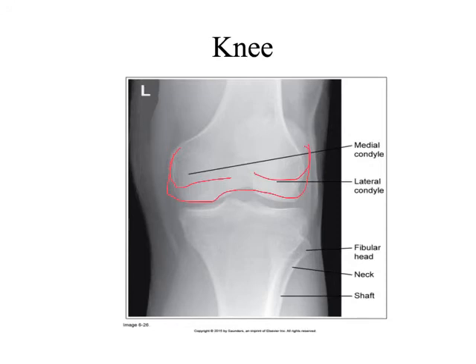Knowing that that's a medial and lateral femoral condyle, what can we say in terms of image analysis about marker placement on this image? It's incorrect. This is not the left side. This is the left side. Okay? Good work. We want to see them symmetrical. We want to see that intercondylar eminence here, this little guy, centered within the intercondylar fossa. So we've more or less centered right on the joint space, right?